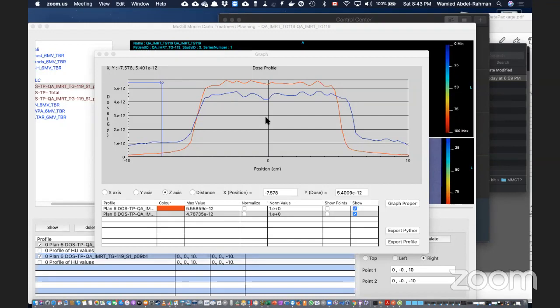What I suspected is I probably have the MLCs defined at a different source distance, not the appropriate distance. It is off. And I've copied the values I got through the Monte Carlo package from Varian. I checked it twice and it's not working. So I have a problem with the geometry of the MLCs.